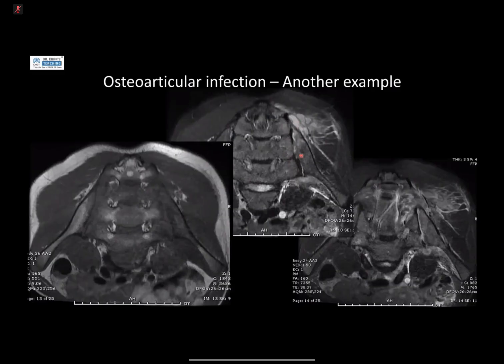And what you have here is quite a lot of fluid, a high signal within the joint, which extends outward into the soft tissues. And then post-contrast, you see these nice little abscesses within the soft tissues. And this is capsular hypertrophy or protrusion. That's one of the key features to know if there's an SI joint effusion, this capsular bump at the top part of the SI joint. Okay.